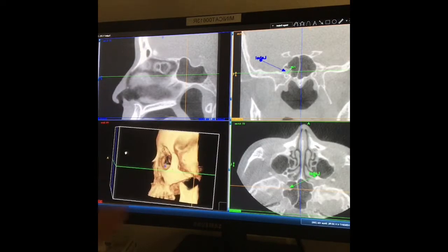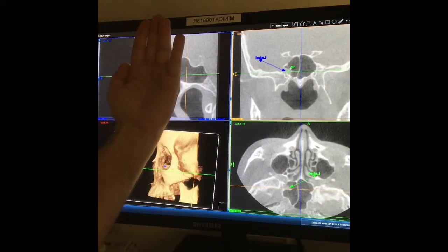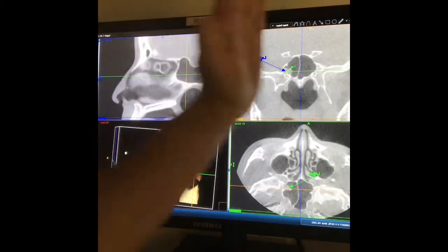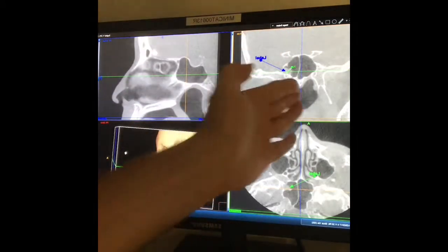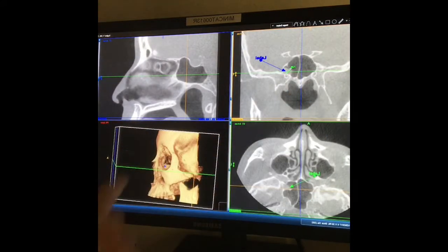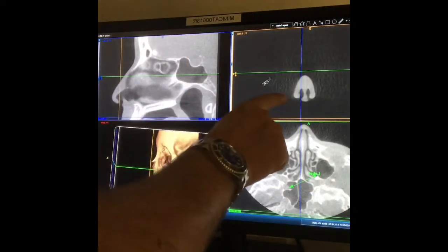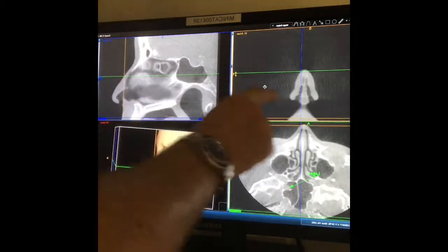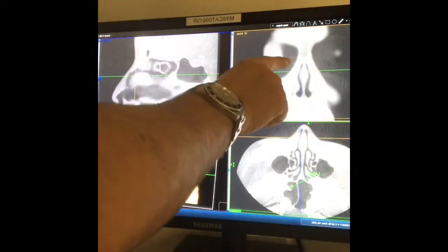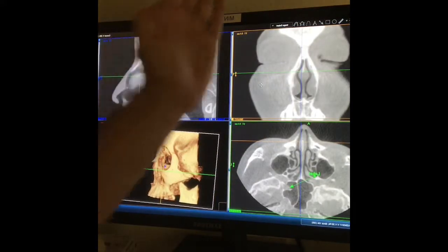So we'll turn her head sideways here, and this is the sideways view. It's three different dimensions. We got the sideways view with her brow, her nose, her lip, and this is her nose. This is the front view here, and this is laying down the back, looking straight up the ceiling view here. So if we take this orange line here and scoot it out to the tip of her nose, her upper lip, her brow. So as we move in here, we get reoriented from the side view to the front view.